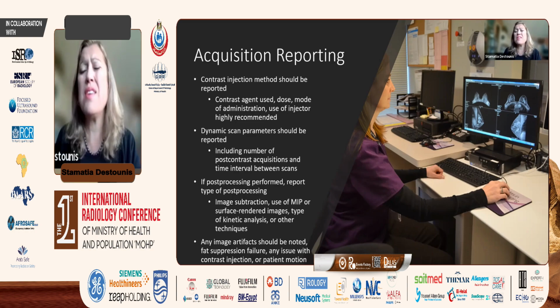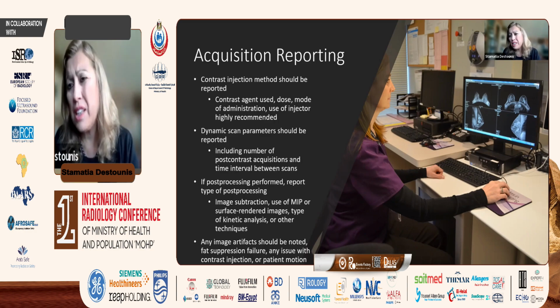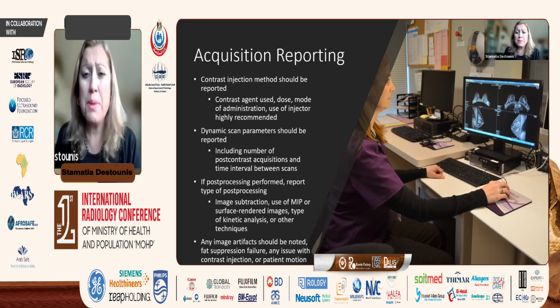Now, some patients have extensive post-surgical changes and surgical clips. There's a lot of artifacts which have to be stated. There may be fat suppression failure or something may go wrong with our contrast injection. Those are things that we have to add to our acquisition reporting. And there may be patient motion, so that all has to be stated.